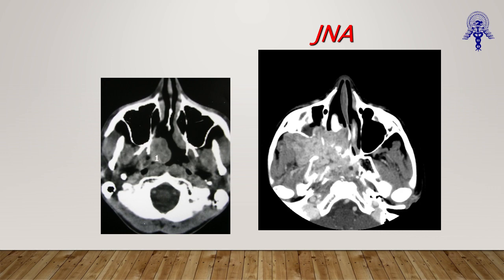a contrast scan. So when you read a scan for anything in life, you first should see the window setting, then you should see contrast or not. If contrast is given, it is written, because your diagnosis may change depending on whether you are reading a contrast scan or a non-contrast scan of the same finding.